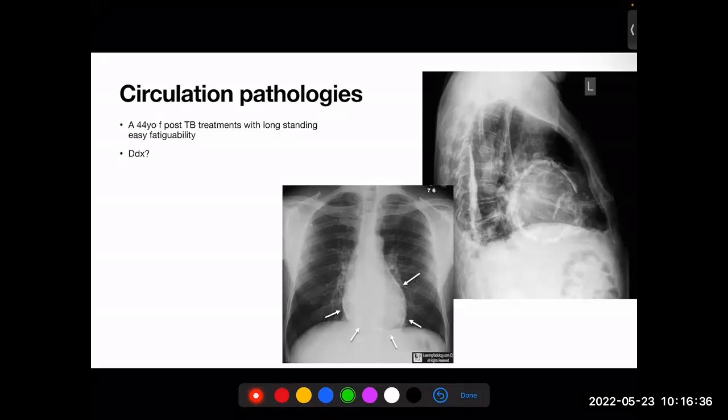Look at the trachea. Okay, looks normal. Look at the lungs again. Looks normal. The aortic knuckle is sitting outside. But then look at the heart. In terms of the anatomy, it looks normal. But there is this lesion around it. Is this lesion in the heart or is it outside it?